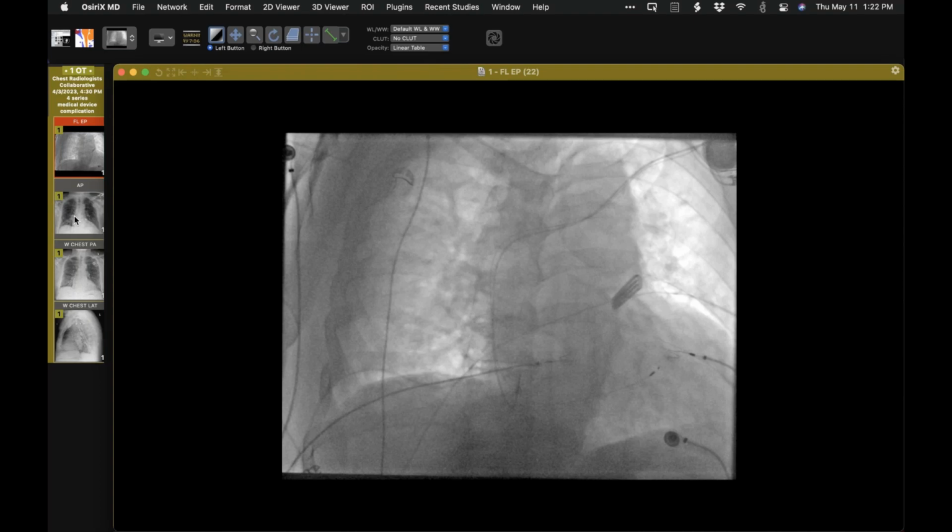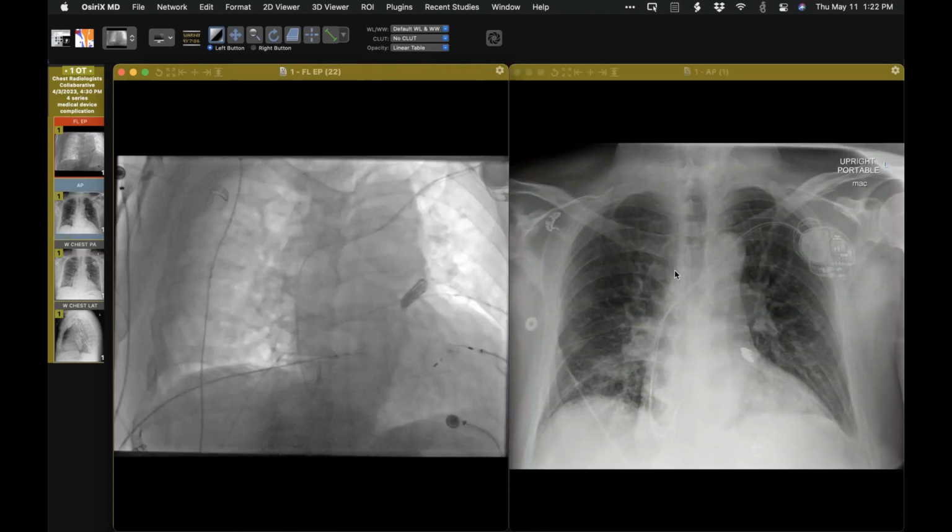And then typically the one that everyone gets is the post image. So this is very soon thereafter. And then the patient is kept overnight, radiography the next day, planned discharge. So when we look at the leads, atrium, ventricle, atrium, and they're really hard to see that ventricular lead, which is kind of cut off.